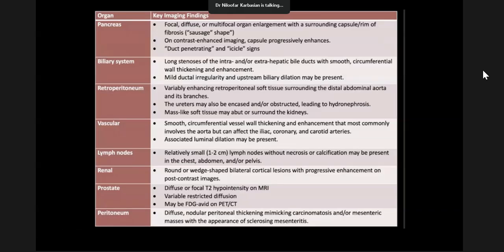And also the peritoneum, mimicking peritoneal carcinomatosis, similar to peritoneal lymphomatosis. They can appear as nodularity or masses. And sometimes the mass is a central mass with some calcification tethering the bowel, which we call sclerosing mesenteritis. Also, a part of sclerosing mesenteritis cases is IgG4 disease.